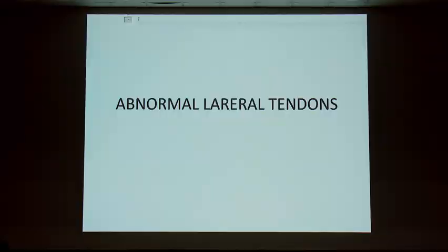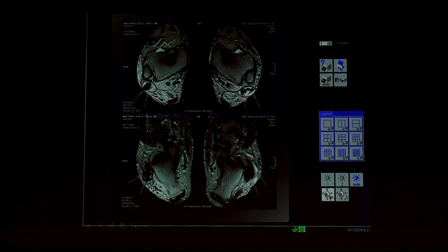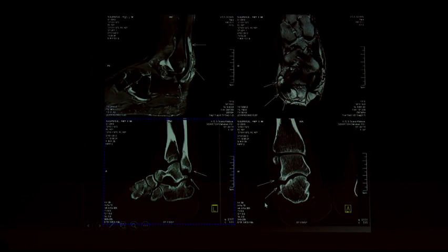And what are the things that can occur with abnormal tendons? In the abnormal tendon, you can see the peroneal retinaculum has ruptured, so the tendon has started subluxating. Apart from that, there is an intratendinous tear with tenosynovitis. The same thing is happening on the opposite side also. You can see the superior peroneal retinaculum rupture with the longus tendon tear and tenosynovitis. And you can see here also a severe form of partial tear with tenosynovitis of the peroneus longus. And you can see the typical appearance of both peroneus longus and brevis. Both have gone for tear with tenosynovitis changes.